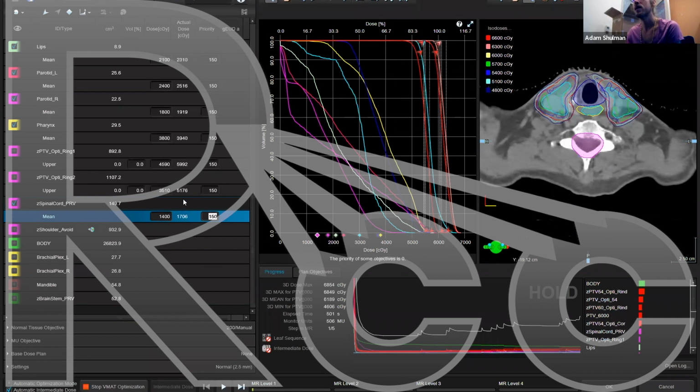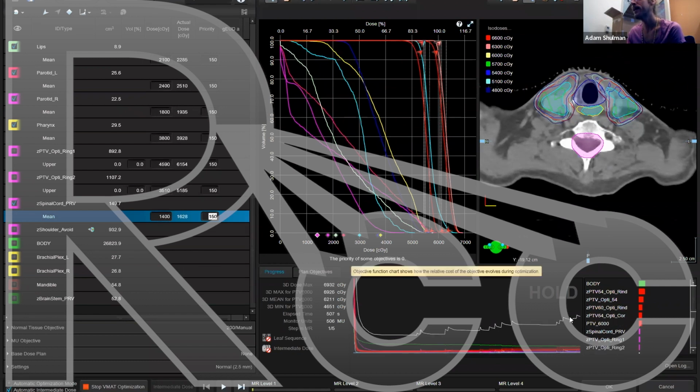Okay, so then we've pushed it a little bit more. We're going to let it sit. We're going to let the error bar flatten out, which means that we've pushed it about as far as it's optimized everything that's going to optimize. Our shoulders dropped a little bit, so that's probably about all that we're going to optimize in this level. Then we're going to unpause it and let it go.